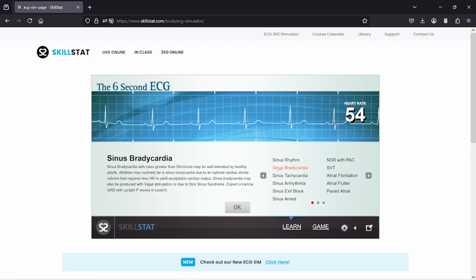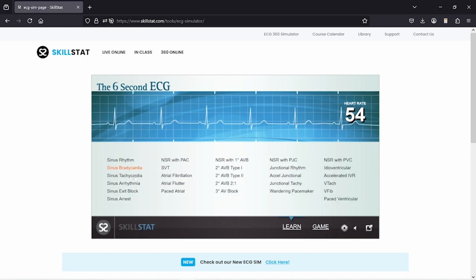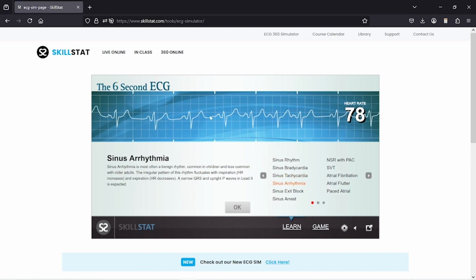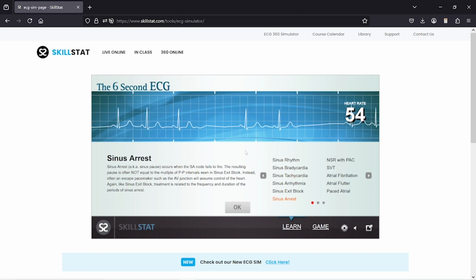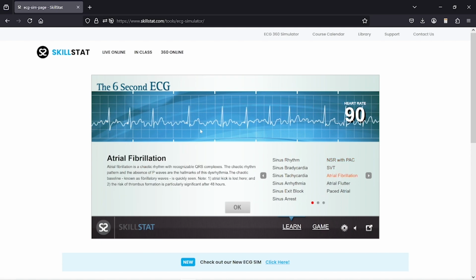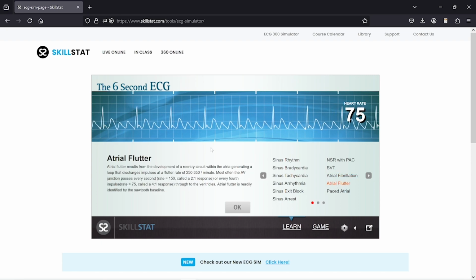We have all kinds of fun rhythms here, right? We have things like sinus bradycardia, tachycardia, arrhythmia. I don't really care for the arrhythmia or the arrest, but that's why I talked about it in a previous video, because I figured it would complement this one really well. We have different rhythms, like a sinus rhythm with a PAC, or premature atrial complex, SVT, atrial fibrillation, which is just a garbled mess, an irregularly irregular rhythm where we can't tell where the P wave is, and atrial flutter with a saw blade.